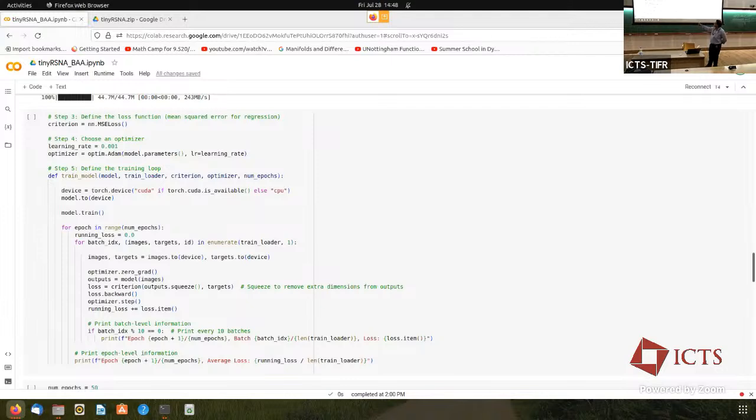So for the number of epochs, you can keep it 2, 5, small numbers so that you make sure that things are running. When you're confident your code is working and you want to lower your loss as far as it'll go, then you typically run high epochs. That's more production code.